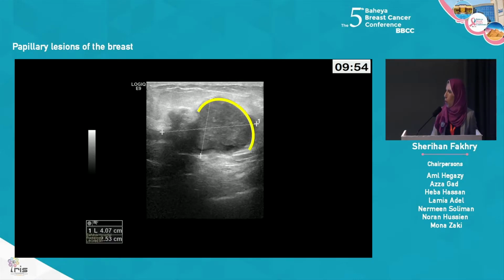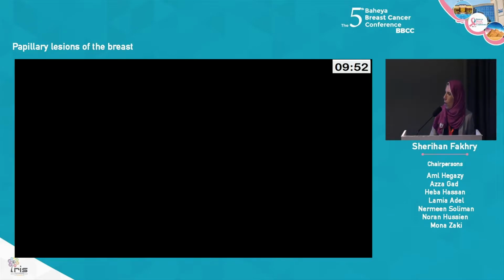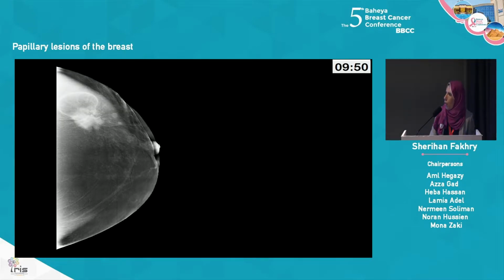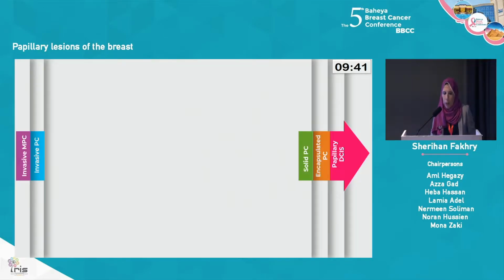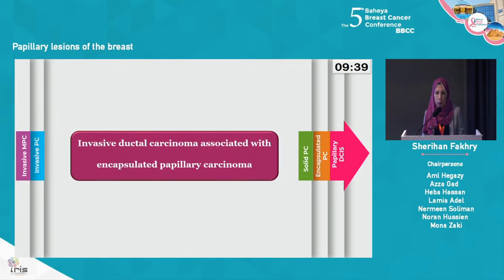That was confirmed by complementary ultrasound, and by contrast mammography, there was a marginally enhancing cystic lesion with an intensely enhancing spiculated component. Postoperative pathology revealed invasive ductal carcinoma associated with encapsulated papillary carcinoma.